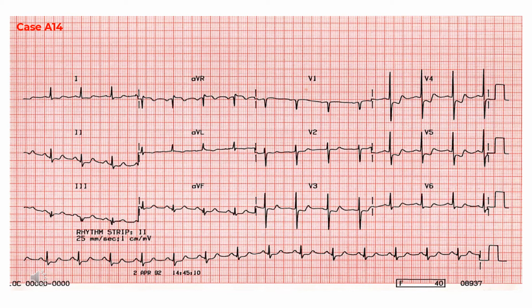The ST-T changes seen here are very different to those in the previous examples recorded in the early stages of infarction. The appearances of the ST-T waves are not absolutely diagnostic of ischemia, and similar appearances could be recorded in left ventricular hypertrophy, conduction disturbance, or in patients taking digoxin. However, in this case none of these factors apply, and the changes were transient and developed acutely after an attack of ischemic chest pain. They provide valuable diagnostic evidence of myocardial ischemia in this case.